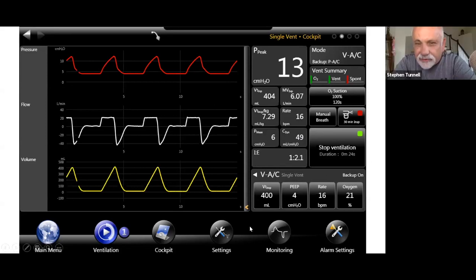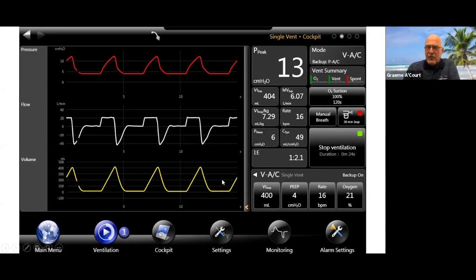So this is monitoring on the right, or these are actually just... No, this is settings. These are derivative. Basic setting, right? Basic setting. And this is some basic monitoring, pretty basic. So some dependent variables, so to speak.